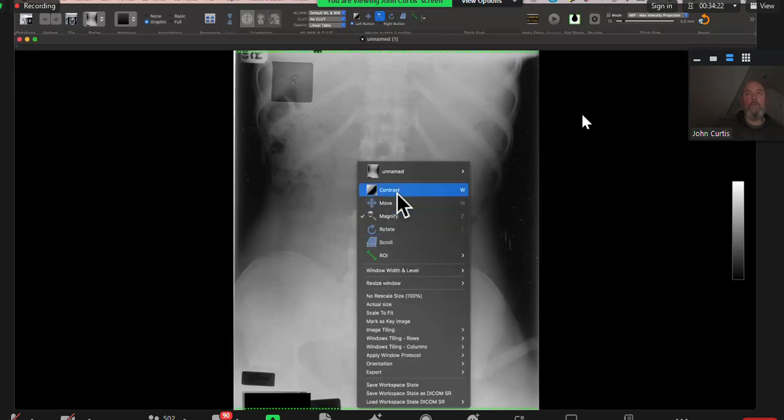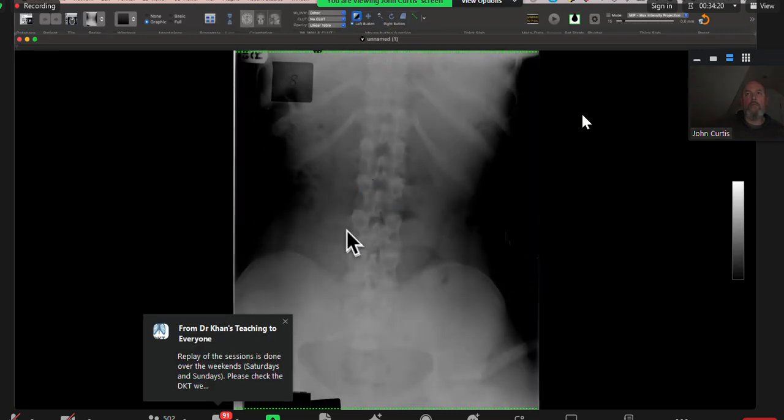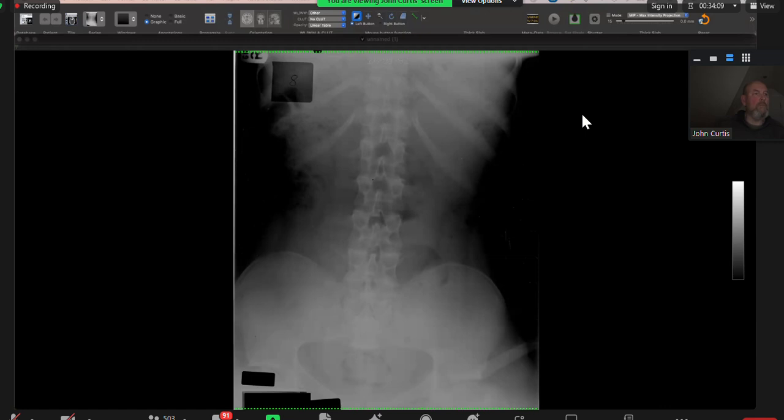Yes. The main abnormality I can see is an abnormal configuration of the pelvic bone. The pelvic inlet looks like a champagne glass, and I can see tombstone configuration of both iliac bones.